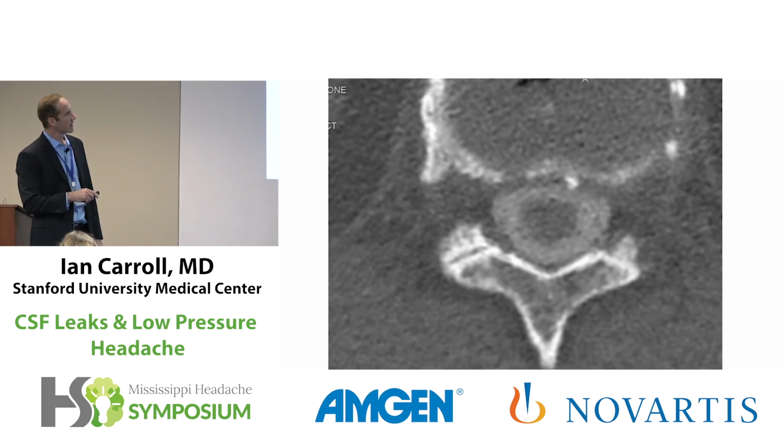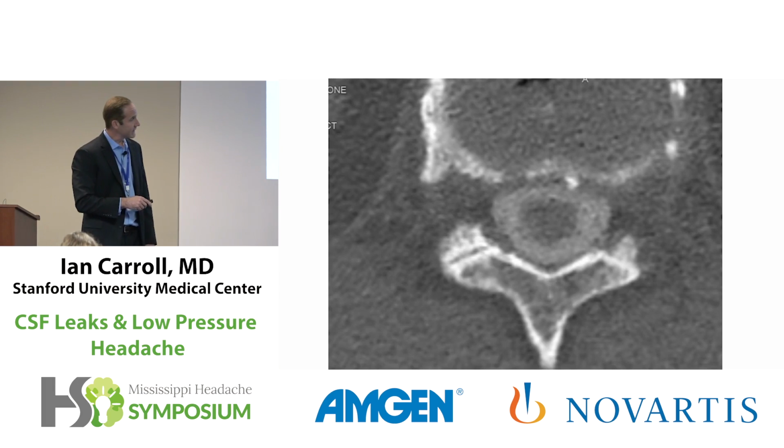And this is what it looks like on the axial. Look at that nice little calcified spike poking right towards the dura. Easy to see why someone with this would suddenly develop a leak. But again, what you do not see is a well-contained fluid collection here.